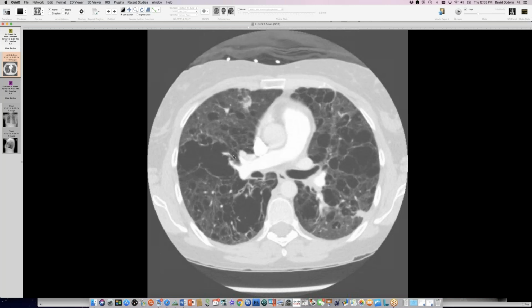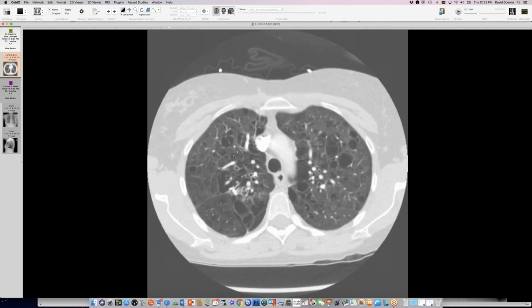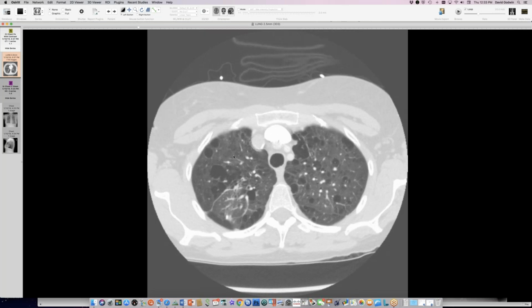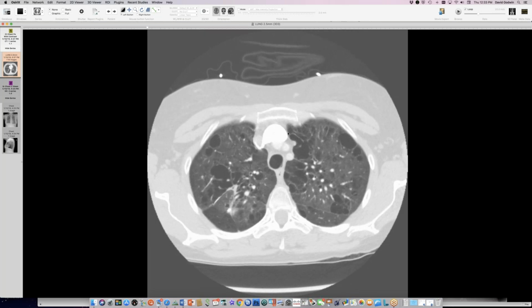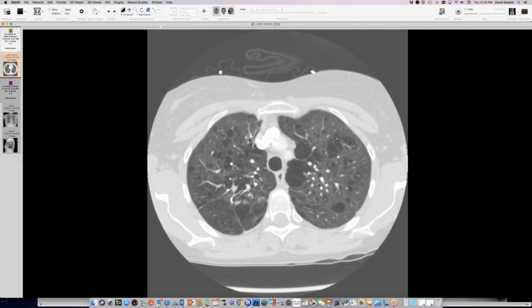I mean, there are weird emphysemas, so I guess that could explain some of it. But sometimes you get discrete emphysema. We've talked about that before. I've seen, it looks like cystic lung disease. This looks like paraseptal emphysema here along the mediastinum. Okay, so that's what I thought.